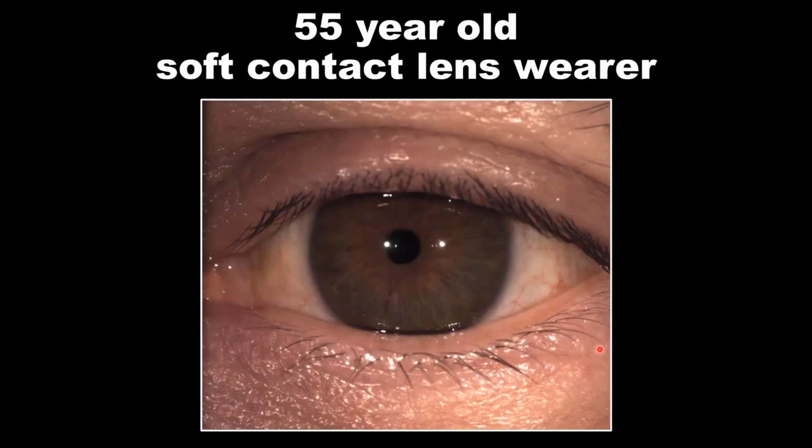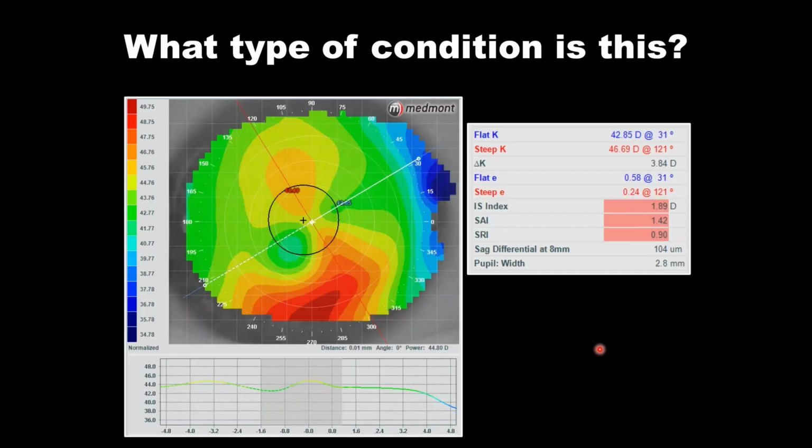Now let's switch to contact lens wear. Here's a 55-year-old patient that is a very successful soft contact lens wearer. As we know, it's not uncommon for our patients to hit their 40s and begin to drop out of soft lens wear due to dryness or presbyopia creeping in. Why was this patient so successful?